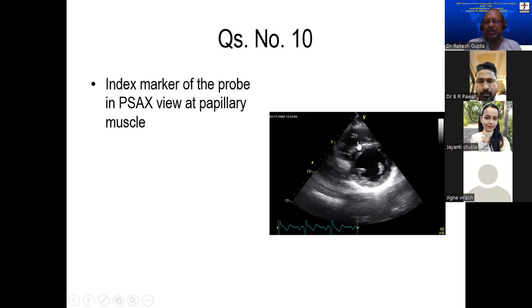To assess pressures between RV and LV. Suppose you have a right side volume overload. How does this behave? They become flattened, D shape it will become. D shape. Yes. Remember that everything tells you something in these images. We'll come back again. Just don't go away.